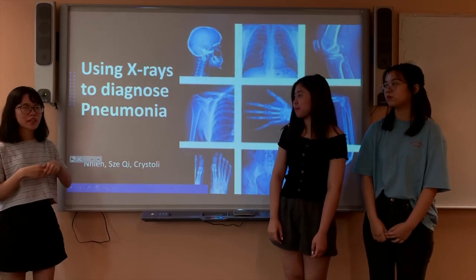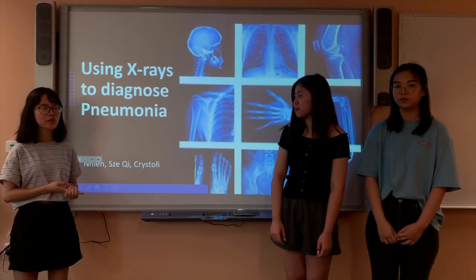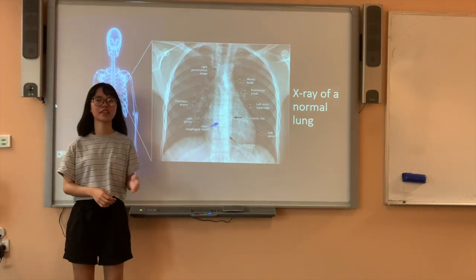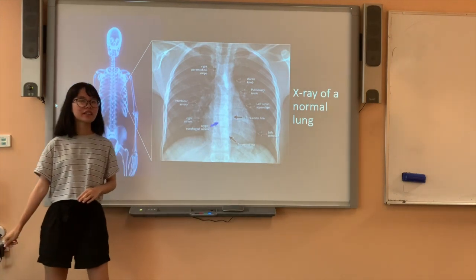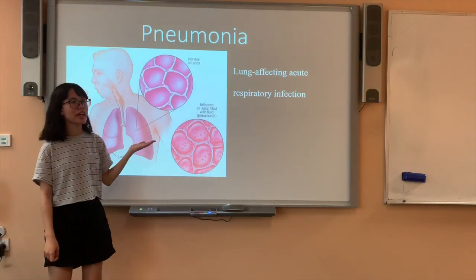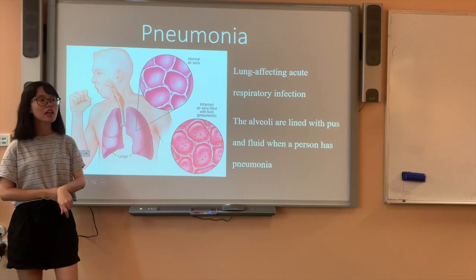Today I am going to demonstrate how we use X-ray to diagnose and possibly treat pneumonia. We will focus on X-ray for lungs, and as you can see here, this is an X-ray of normal lungs. Our disease today is pneumonia, a lung-affecting acute respiratory infection.